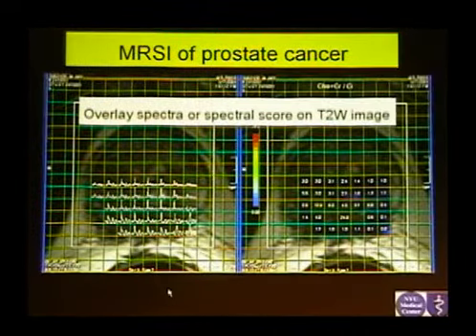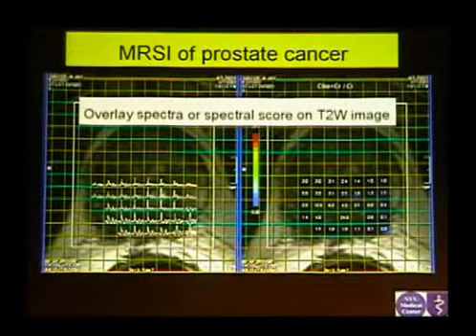Okay. So this patient was like 75, and he had some remote history of high PSA and cancer treated a long time ago, like 5 years before. And he had all this, I don't have the T2 images, but you see, behind that there is extensive low T2 signal in the prostate, so we're not sure whether it was residual, post-treatment changes with some stuff around the prostate that was probably residual extracapsular spread, or was it active disease?